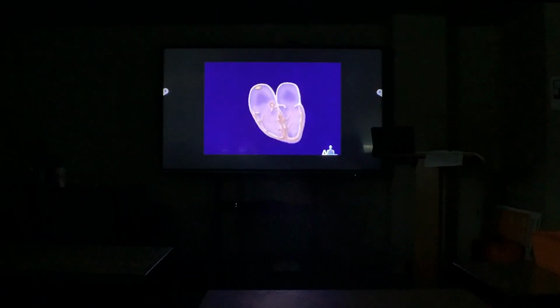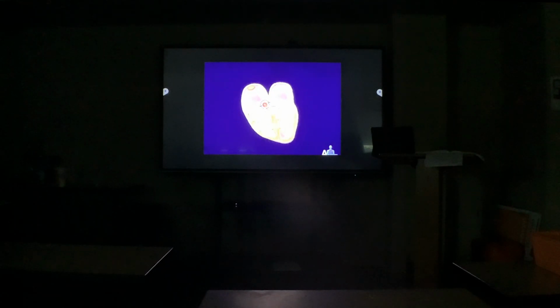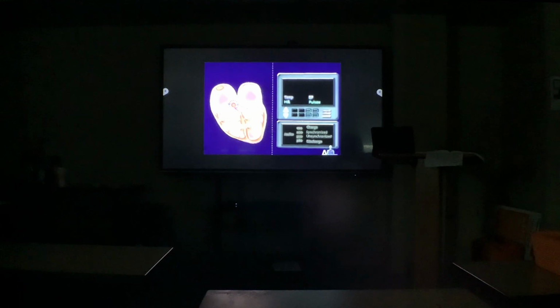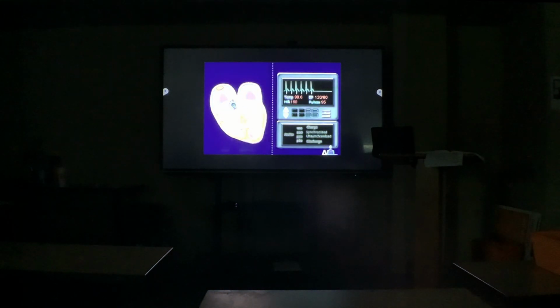Adenosine has a very rapid half-life and must reach the central circulation rapidly in order to be effective. This patient's blood pressure is normal. Adenosine acts on the AV node to block conduction. Note that in doing so, there is a brief period of asystole. The re-entry circuit was also blocked by adenosine, allowing for the resumption of normal sinus rhythm.